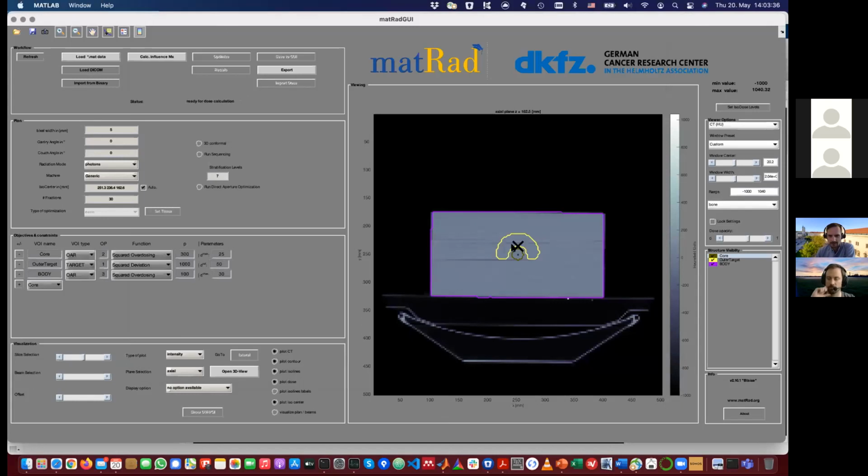Right. We went through this phantom already a couple of times. So by now you should know that this yellow region is our target region, and here we have an organ at risk at a very delicate position.